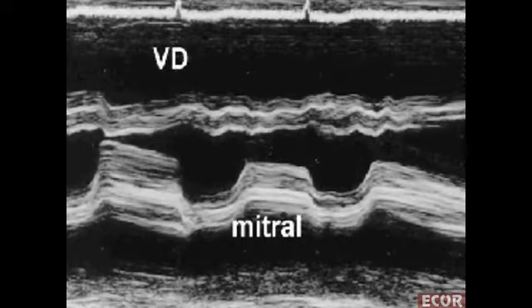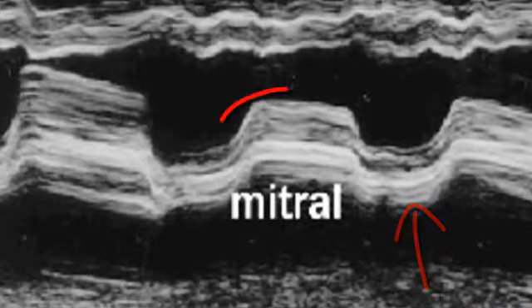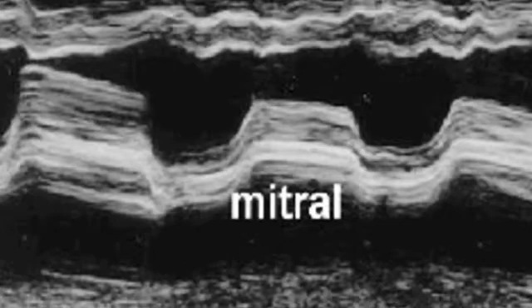Watch this M mode of a calcified mitral stenosis. There are lines here from calcium, but also regions where you see no perfect lines, but smudge in certain places and also torn paper sign. So there is endocarditis. These signs have to be searched for with M mode.